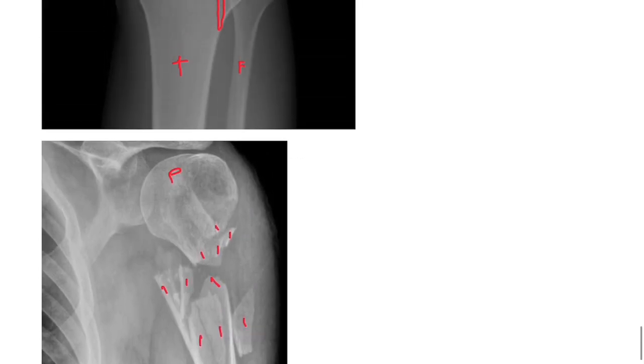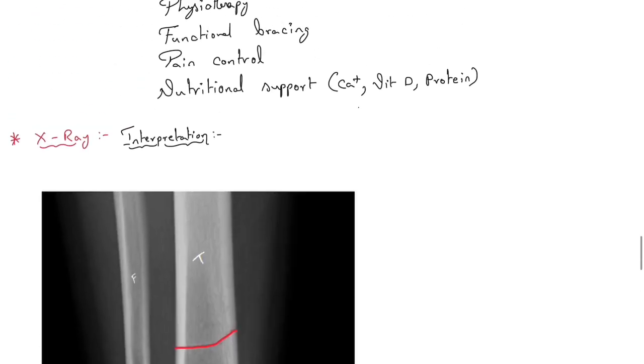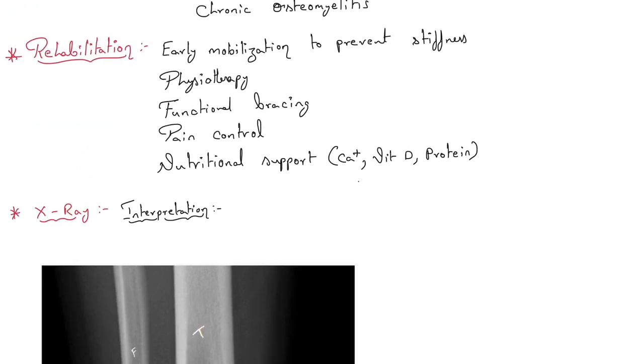Okay, so now this is your question. I want to know what type of fracture this is. Okay, that's all. So today we discussed some introduction of fractures.